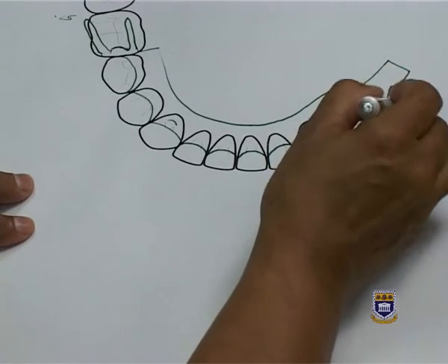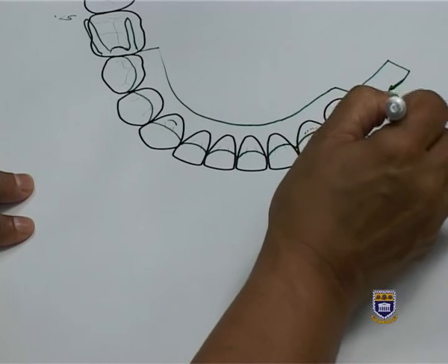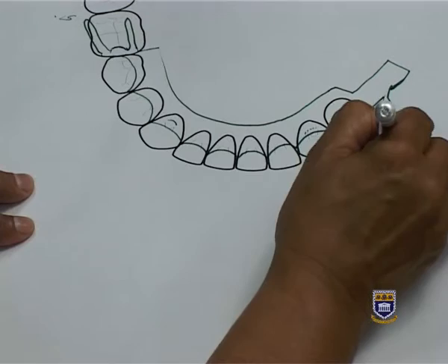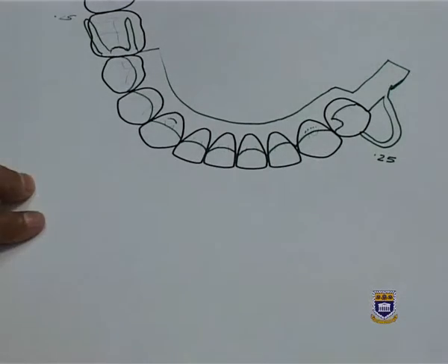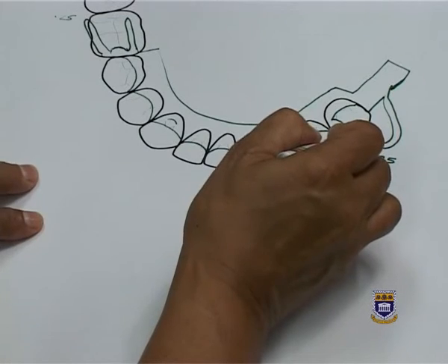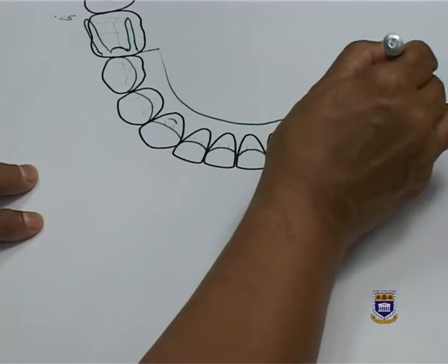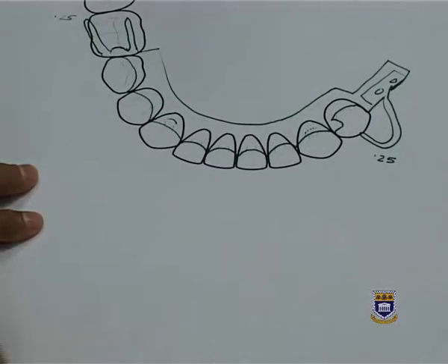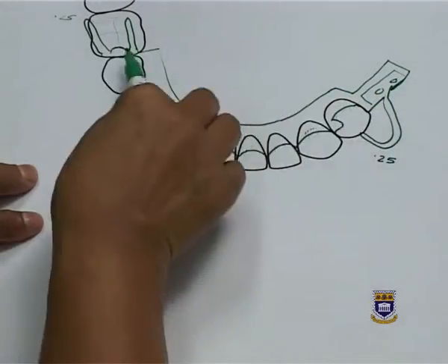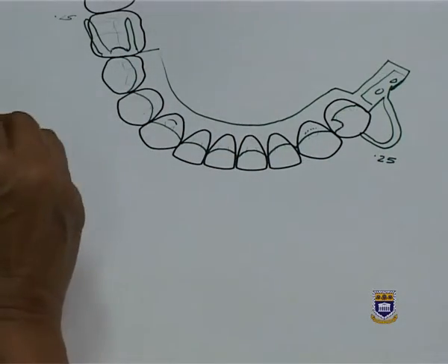So I've indicated that my gingivally approaching clasp is a chrome cobalt and therefore also engaging 0.25 undercut only. It's chrome cobalt, which is a rigid material. Have to indicate where my acrylic is going to be attached. I have provided enough horizontal stability. I have covered all the teeth because it's a lingual plate.